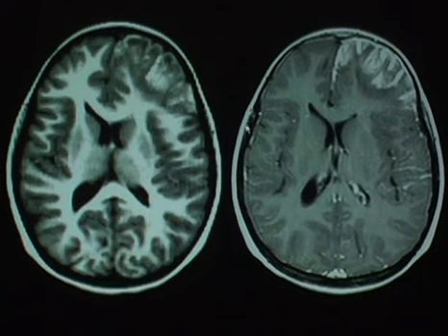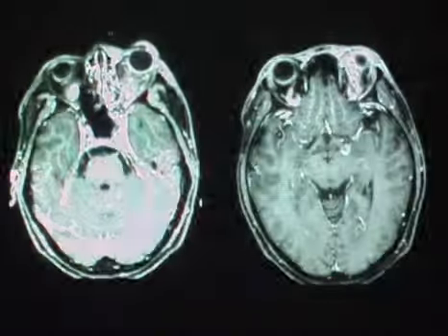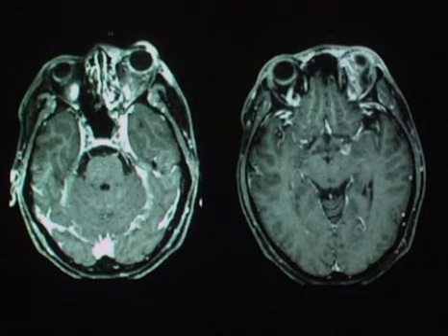What we see on the pre and the post-contrast T1 weighted imaging is an area of mass effect and poor distinction of gray-white interface at the left frontal lobe. There's extensive enhancement seen in both extraaxial spaces as well as within the parenchyma here on the post-contrast imaging with some minimal rightward midline shift. We've got some prominent associated restricted diffusion seen here, and what this turned out to be was not even just a simple case of cerebritis, but a venous infarct owing to thrombosis of a frontal cortical vein. Here's another example of a different type of complication.